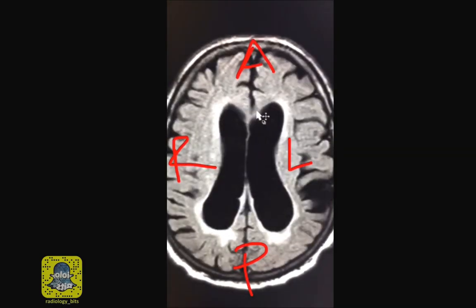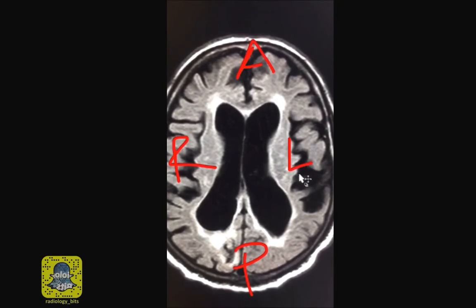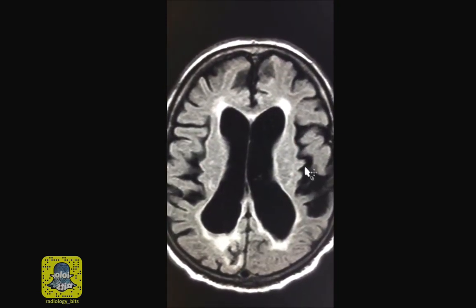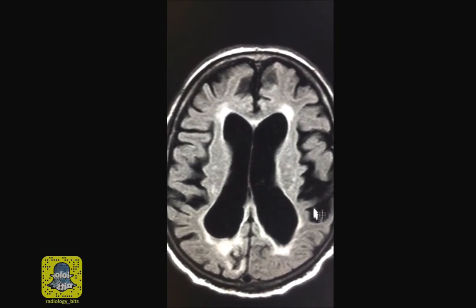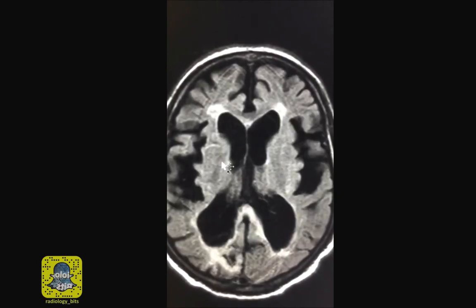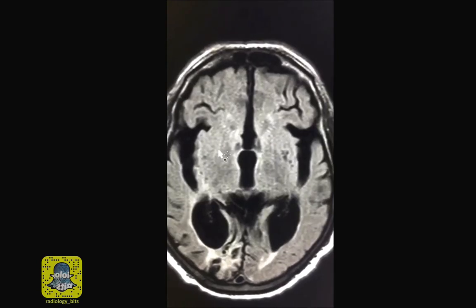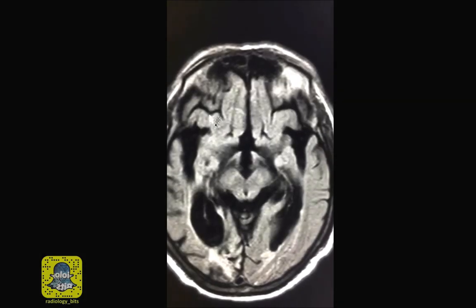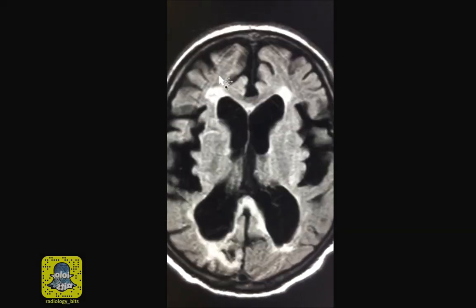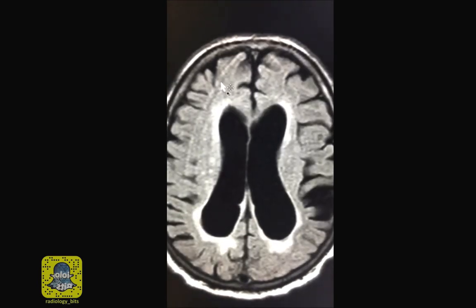So we agreed this is a FLAIR image of the brain. This is anterior, this is posterior, right and left, and it's as if you're looking at the patient from his feet. The first thing you notice is that the brain seems to be atrophied. The volume of the brain is less than expected. This is something that we commonly see when compared to younger brains. You have a more pronounced appearance of the CSF spaces and a decrease of the volume of the brain. A finding that's not surprising in an 80-year-old male patient.